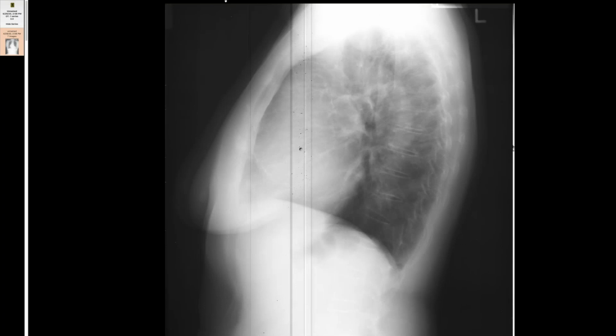So these cases were scanned yesterday. The scanner hasn't been operated for some time, and there are some streak artifacts. I'm going to try to have these redone after some cleaning.